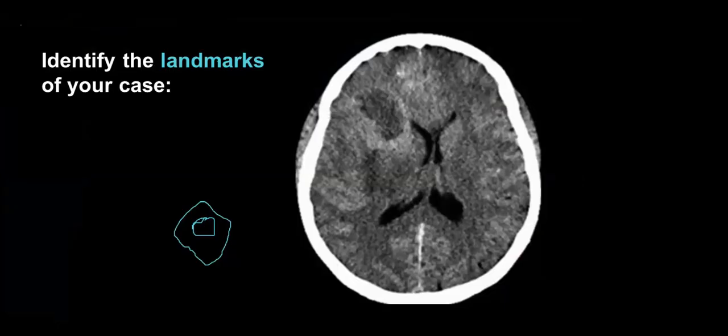So we have completed the landmarks. Now identify the landmarks of your case. Contralaterally, what landmarks could be there? What is this? Caudate, sir.